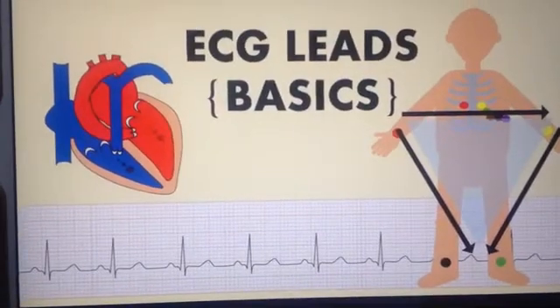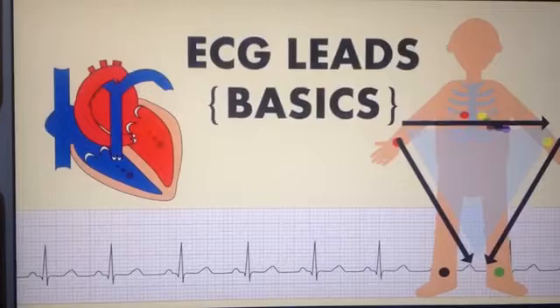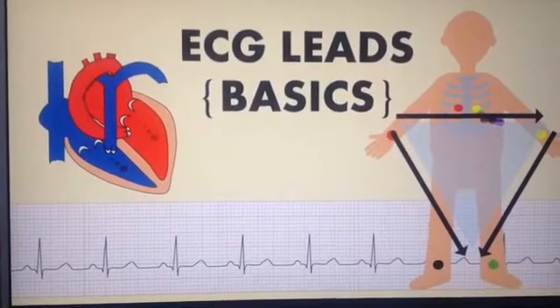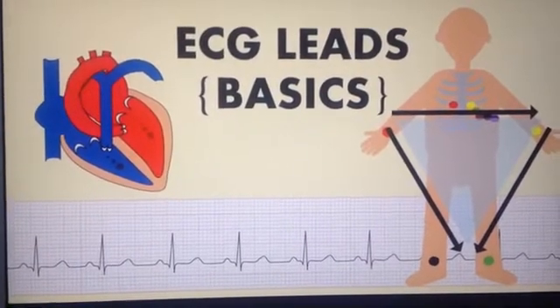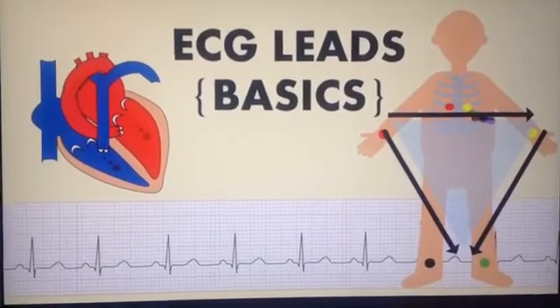Hello everyone, today we are going to be talking about the ECG chest leads, also known as the V leads, also known as the precordial leads. They are called precordial leads because they are attached to the chest, right?